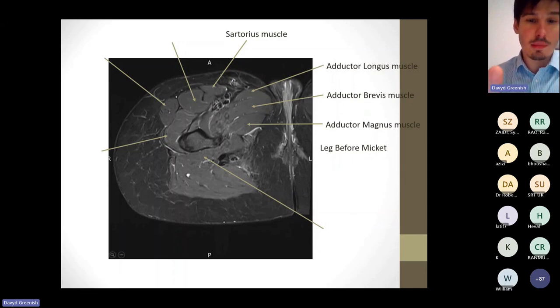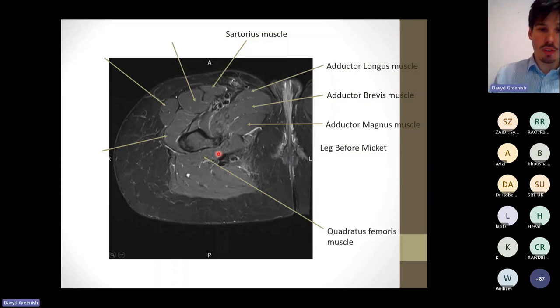We can't see that obturator foramen at all. We've dropped off the bottom of the ischial tuberosity. We've just got the femur. We've got quadratus femoris again at the back here, which is anterior and medial relative to the gluteus maximus here. And we've just got the beginnings of another big anterior muscle coming in here.